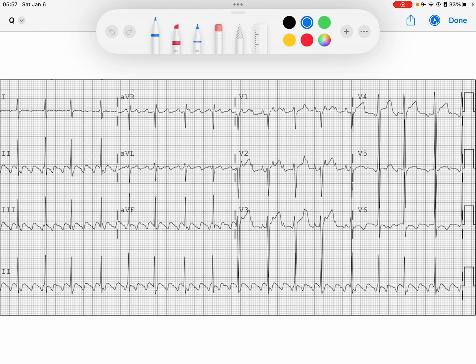So first thing I'm going to do is take a look and understand just what's going on with this EKG. I might look at lead 2. As I'm marching through, I see I've got a regularly occurring narrow complex QRS that's occurring at a rate, if I start here, 300, 150, 100 beats per minute. So we've got this narrow and regular.